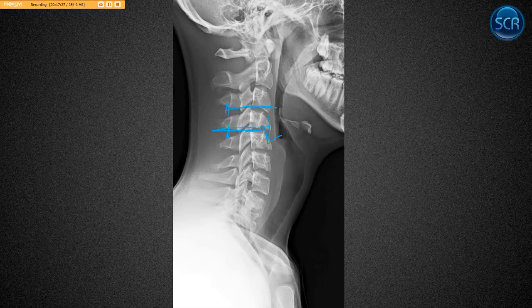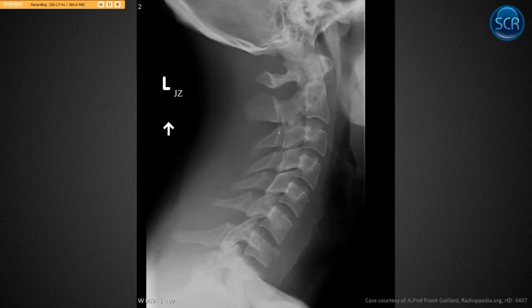They go the whole way across. So this person luckily didn't have a cord injury, but oftentimes these people become paraplegics because they have a high degree of cord injury. They often have a posterior subluxation, retrolisthesis, that type of stuff. Here's an example of a flexion teardrop fracture down here. So this person, you can see, looks flexed over the top here.